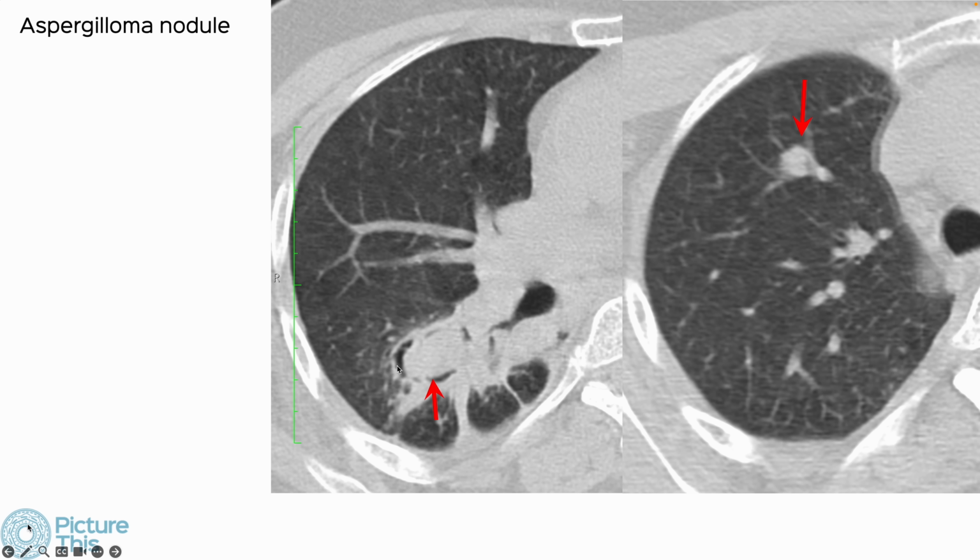Now, this patient who has a CCPA, we see another nodule, we assume this to be an aspergilloma nodule, but this doesn't make a lot of sense. So, frankly, I think the classification sucks a little and needs to be redone. And perhaps we should have more clarity about the definitions as well. And that's fine. I think this is a starting point to try and figure out whether these have prognostic significance or not. To some extent, they do. But I guess eventually in the next 3-4 years, we should have more clarity, and then I'll put that up.